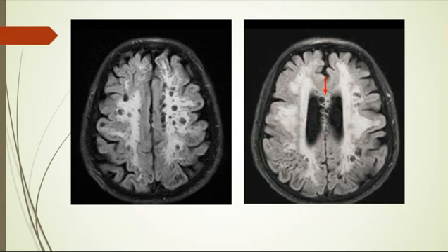What do we have here? Well, we're not looking, no, this is not a DWI. There are multiple cavities, like holes. This has a differential diagnosis of what? First, the sign is the appearance called honeycomb or Swiss cheese appearance. Swiss cheese has multiple holes within it. The honeycomb, or honeycombing, like we see in the lung, the same thing in the brain. The findings are the same.